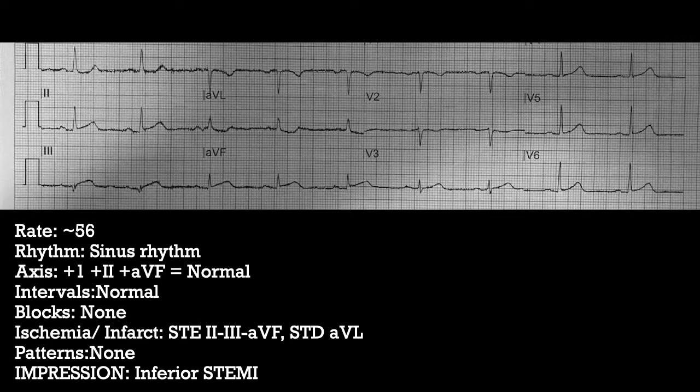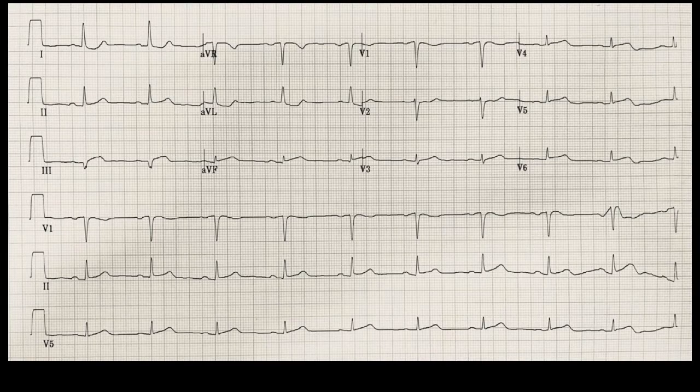For fun, let's look at the in-hospital EKG. Now, again, we've already kind of gone through it a bit, but we'll just see if it looks a little bit clearer, as sometimes it does now that we've got good lighting and we've got the patient more or less still. What we've got here, don't lose sight of stuff. Go through it in an organized process.